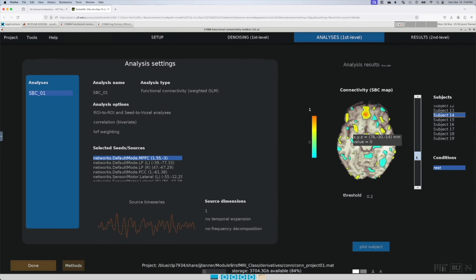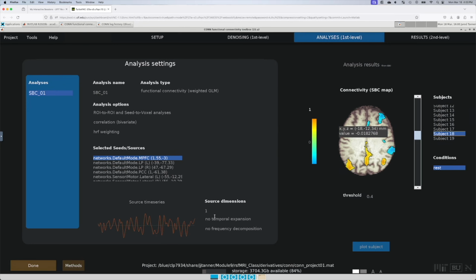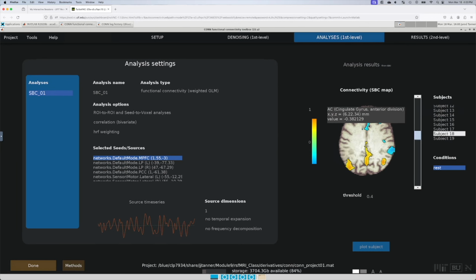But again, this is a little bit messy data, and we're keeping it a little messy because if you happen to be working with people who have brain tumors and are interested in this, these are going to be issues. A lot of other data sets are going to be a little bit easier to deal with, but you need to be aware of potential issues. But we should see some general organization of these, meaning correlation values and all of this.